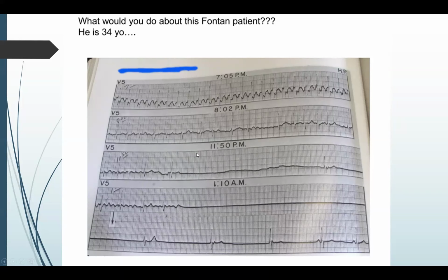Remember that we discussed last week how when people have A fib, sometimes the right atrium and the left atrium look different. I think that's why in the old days, somebody might have referred to this as fib flutter. That term has fallen out of favor because it's kind of a bad term. But I think the bottom line is it's probably some kind of atrial fibrillation, right? The P wave is changing, the P to P is a little variable, the R to R is variable. So it's highly suggestive of that.